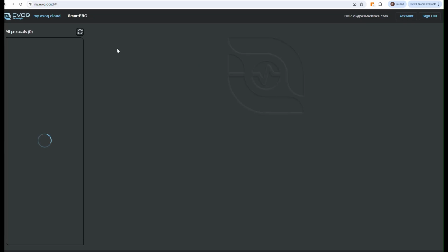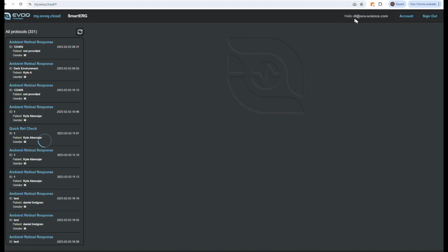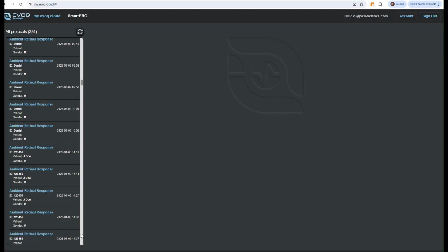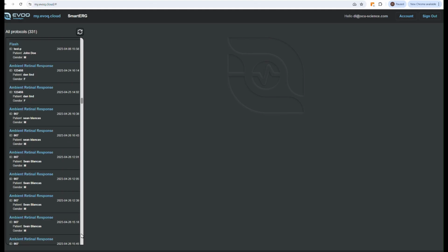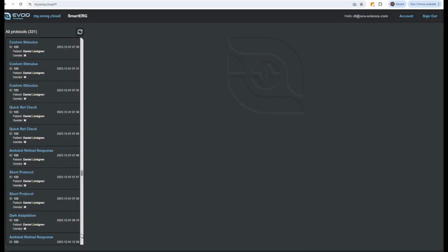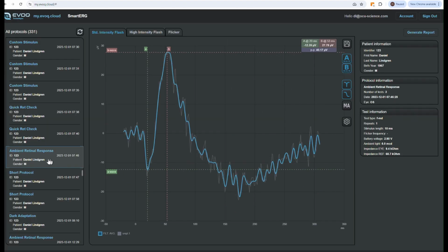The SmartERG, this is my account for dl@ocuscience.com, and here are all the previous emails I've done from everything I've done on testing as well as any type of analysis. Right now I'm showing over 300 ERGs in this folder. If I pick one of these items in the list, I can bring back an ERG.